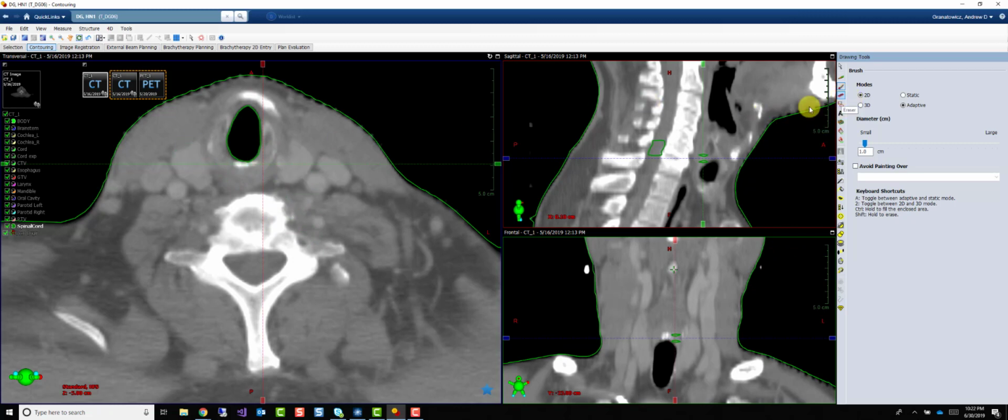The next tool, if you don't want to hold the shift key down, you can use the eraser. It works exactly the same way, you just don't have to hold that shift key down. And you have the same functionality as the brush tool, just only the eraser. It is kind of nice because you have this option here.